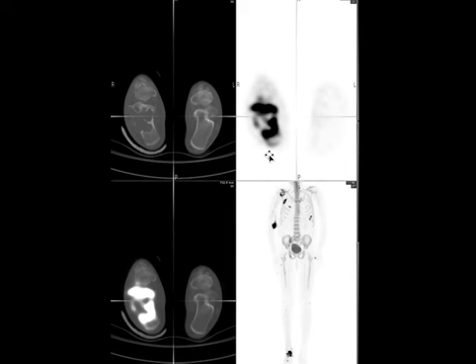Like I said earlier, bone mets in adults typically go to the proximal aspect of the upper and lower extremities because that's where the active bone marrow ends. But in certain cancers, when patients are anemic, such as lung cancer or renal cell cancer, there is bone marrow expansion. So there is more active marrow in distal extremities, and in that situation, bone metastases can go to distal extremities. So those are some of the patterns and things to know regarding an F18 sodium fluoride bone PET-CT.